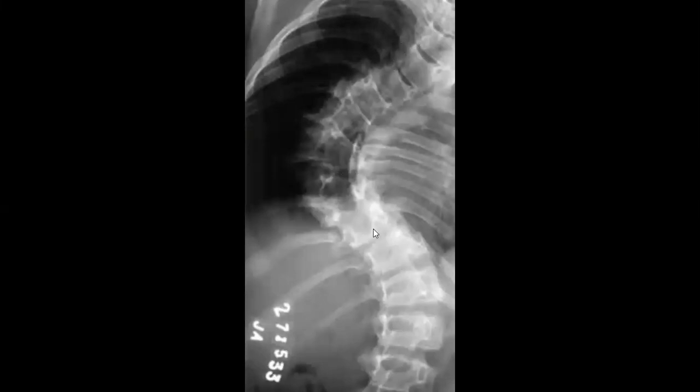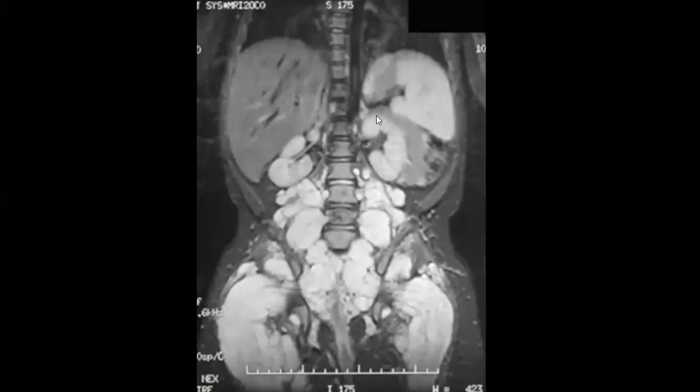Yeah, scoliosis. And in the lateral, yes, you find it to be kyphoscoliosis. Sure, if you find this, it will be pathognomonic too. What is this one? Yeah, kyphoscoliosis, nice.